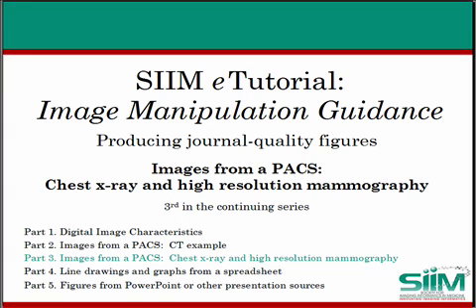Welcome to the Society for Imaging Informatics in Medicine e-tutorial series on image manipulation guidance, producing journal quality figures. This is the third in the series of individual tutorials that explain and show how to produce figures that meet the specified requirements of various scientific journals and other publications.